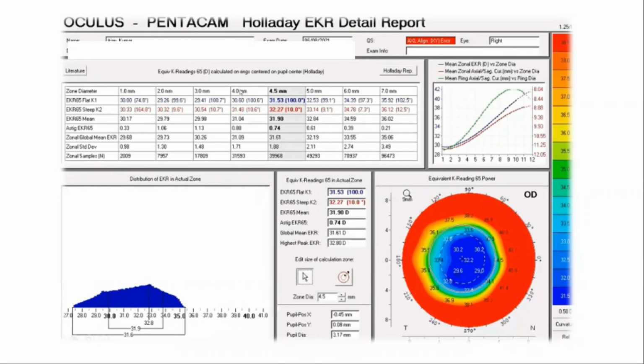What aspect, Dr. Amrita? The angle kappa and the planning for the IOL calculation that was just mentioned, and even the cataract evaluation slides that were just covered. We usually see these things in EyeTrace also while planning a cataract surgery. So does that really help?